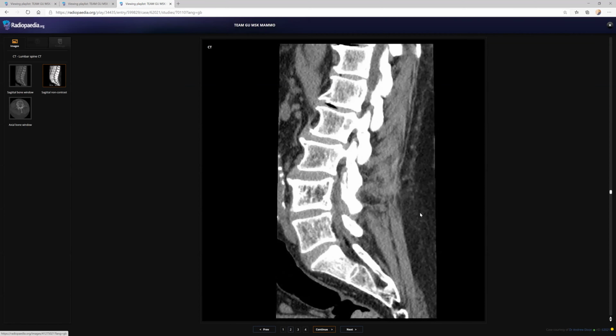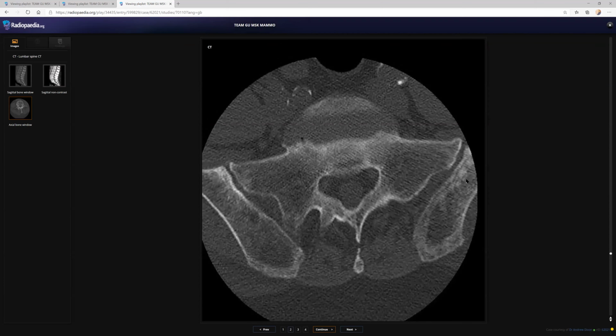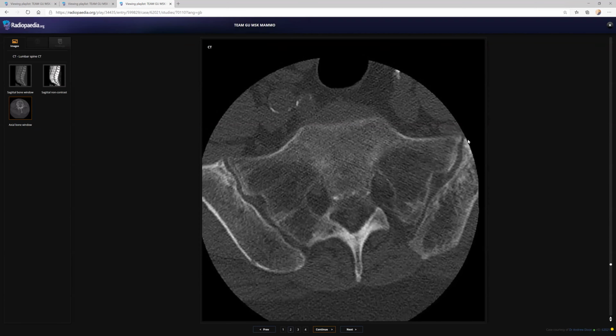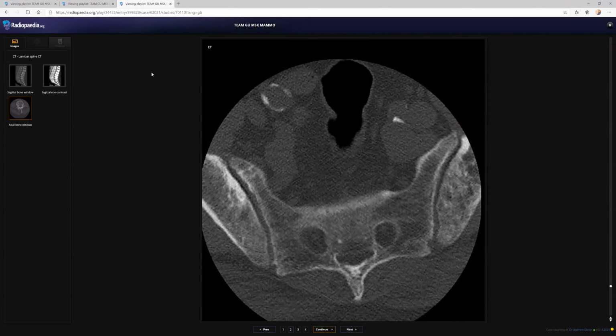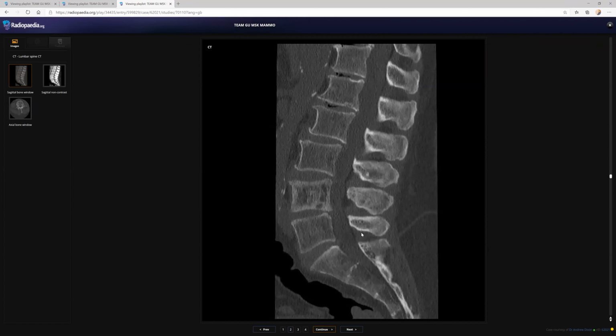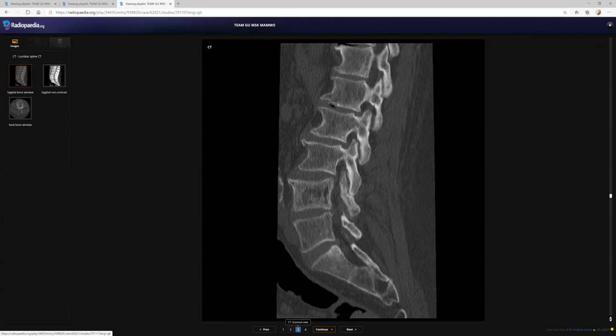And you correctly picked out the involvement of the ilium also. There is cortical thickening, the trabeculae are accentuated, and there is some sclerosis. And you have to look at the patient's age, which is 75 years. Yes, so that is the usual time of Paget's disease. So it is a case of Paget's disease with the picture frame vertebra.